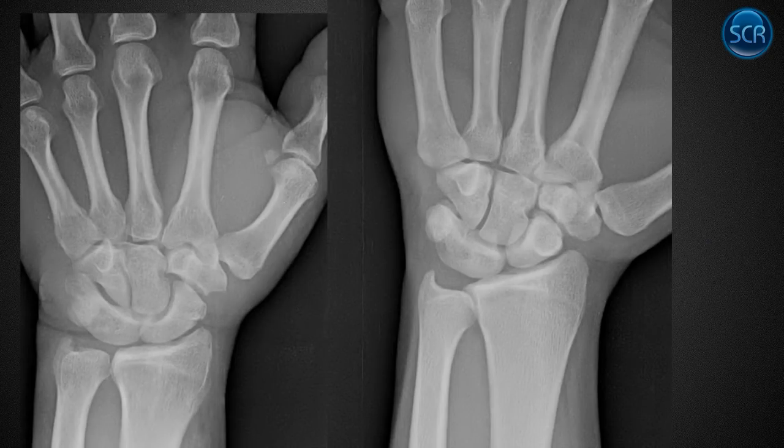Here's an example of the only real congenital thing I'm going to mention in the wrist. It's not terribly uncommon to have coalition, where you have congenital fusion of some of your carpals. It's almost always the lunotriquetral joint. In this one, it looks like one homogeneous mass here. You might say, okay, maybe just projectionally we're not seeing that joint, and that's fair enough. But on this oblique view, you can say definitely this is fused. It almost tried to form a joint here, but it stayed all as one. So this is lunotriquetral coalition.